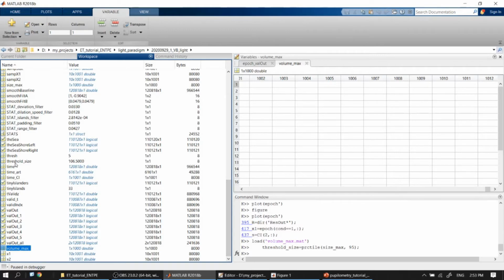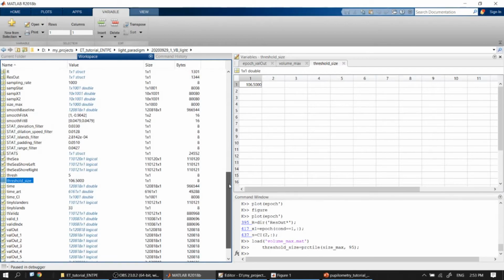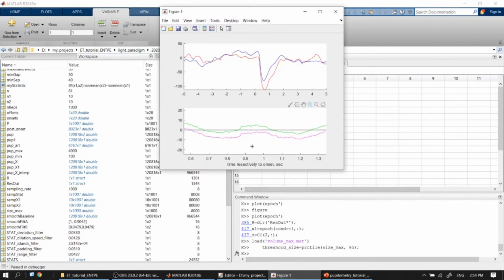The threshold for the size is 106. So this is the size, the extent of the cluster, 100 points, which is unlikely to be produced spontaneously by randomly shuffled data. If we compare this to our results, we can say if our cluster is longer or shorter than this threshold value.